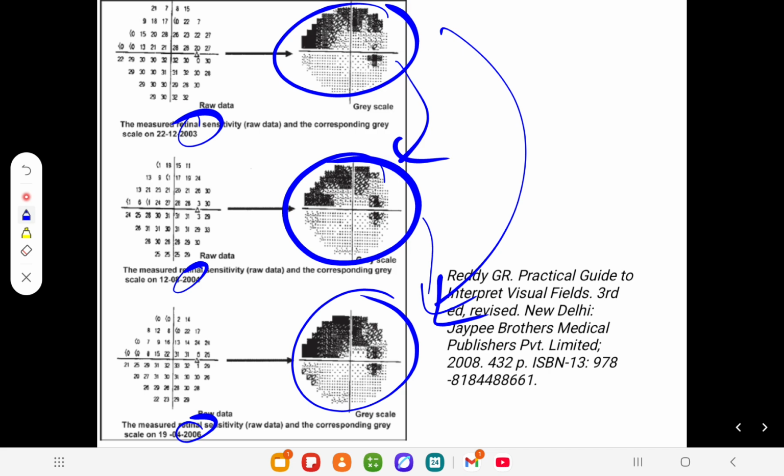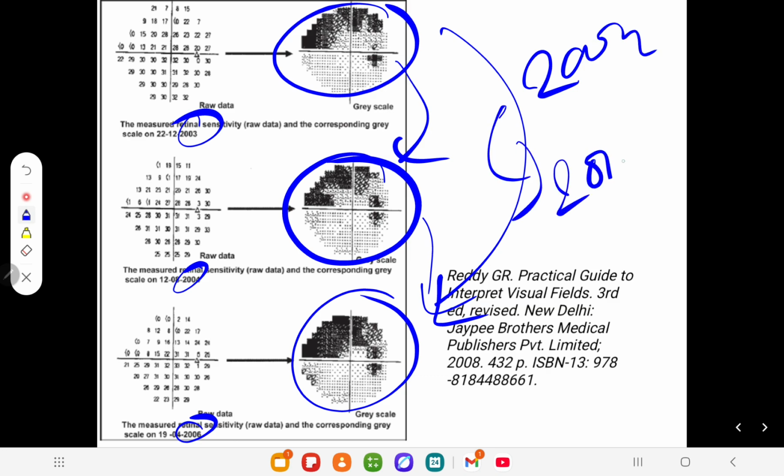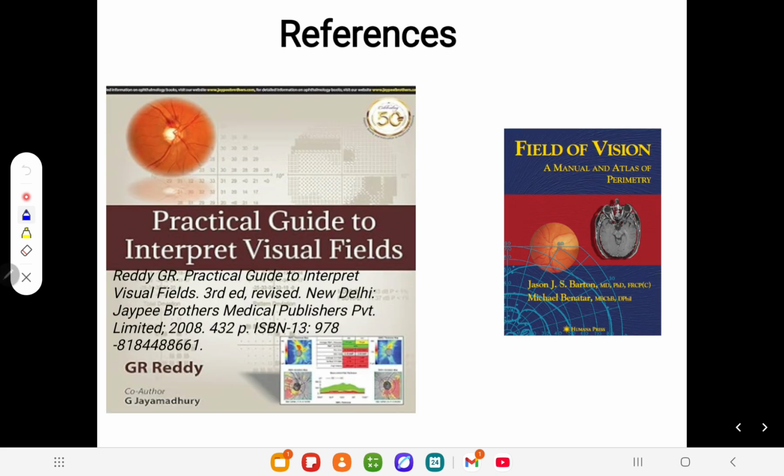and grayscale is very useful to see long-term changes. If there is something like 2002 and 2010, two visual fields, and you have seen a clear distinction, then you can explain with the help of grayscale how much this darker area has gone and how this darker area is basically growing with time. So it's just for that, not for doing any diagnosis. Okay. So I think that's it.